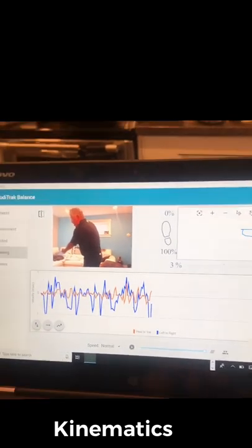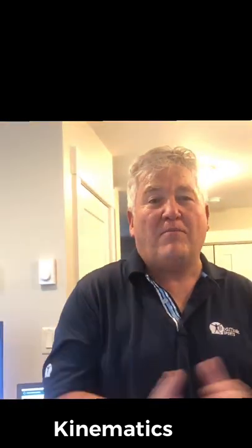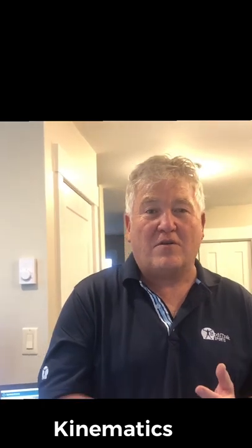Very effective. Terry Hashimoto, just giving you a basic understanding of how to use the user interface with the new BodiTrak balance software.